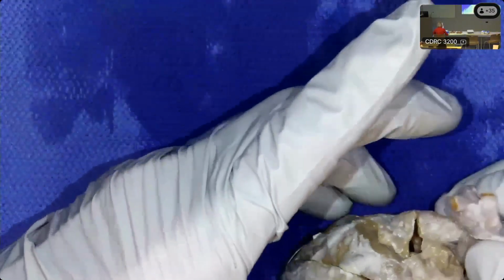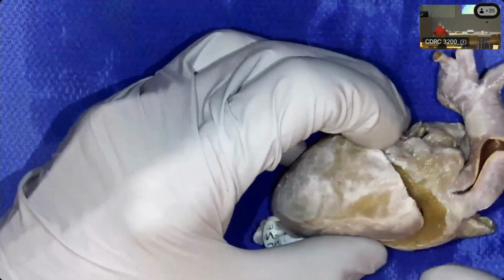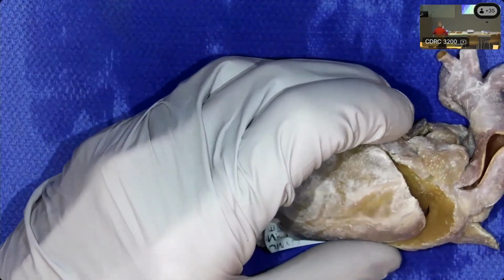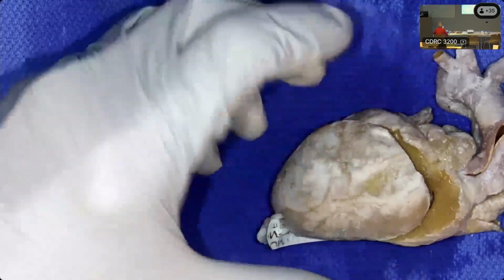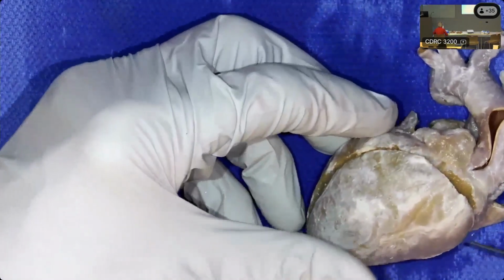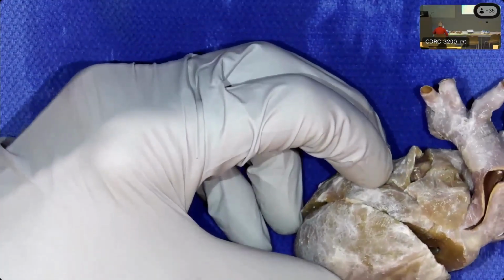So I think I only have one case that I brought that shows the quasi-mirror imaged venous drainage, because I didn't have one in right isomerism that showed usual arrangement. I know we had a couple cases at the Lurie Children's Hospital that showed us both quasi-usual and quasi-mirror imaged.